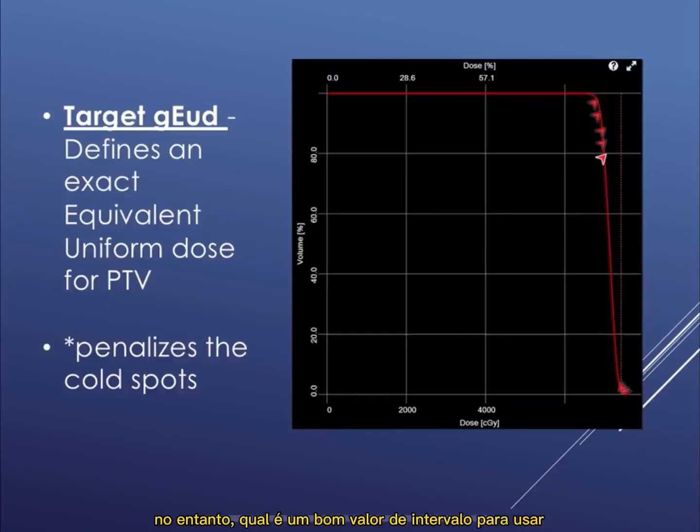However, what is a good range of values to use, since it's such a broad range? It goes from -40 to +40, and there are too many to choose from. Back when, in Eclipse, when you post-process things, it used to be a 1 to 4 value. Currently, we're up to about 20 level values. So trying to figure out which one works.